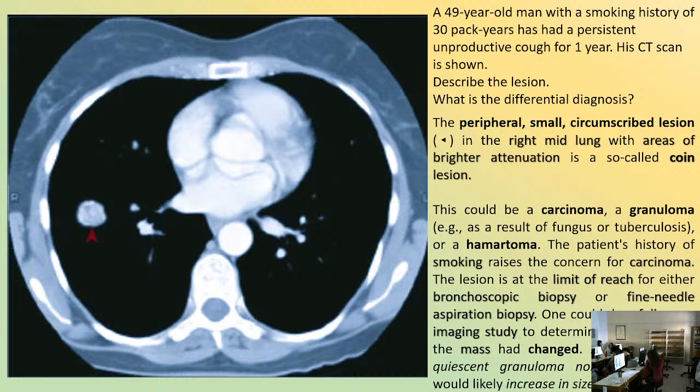Either the giant cells have a horseshoe accumulation of the nuclei, so they are identified as Langhans giant cells. And what else is common in tuberculosis granulomas? Epithelioid macrophages, multinucleated giant cells, mainly of the Langhans type, not exclusively, mainly of the Langhans type.